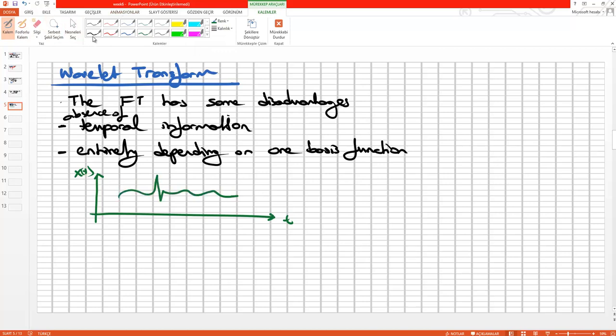Okay. And so, how can we obtain the temporal information from this space? In a normal case, we can take a window pattern here, like this one. Window length can be determined from this signal, and in each case, we can take some signal here as a section: section 1, section 2, section 3, and section 4.